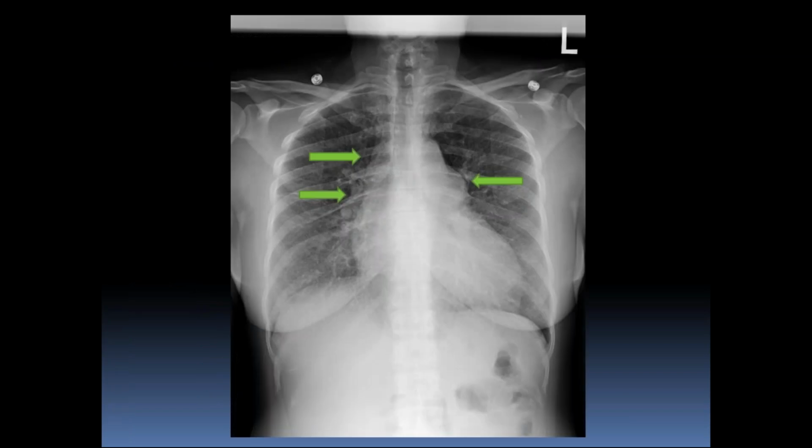So let's go take a look at a couple of different things. So we have a chest x-ray that you can see what's going on here. Got the arrows pointed out, the symmetric adenopathy. This is not to be confused with the asymmetric adenopathy that you typically get with lymphoma, that being the other major differential. So we've got a pretty wide right paratracheal stripe. You've got a pretty beefy right hilum, and then you've got a pretty beefy left hilum as well.